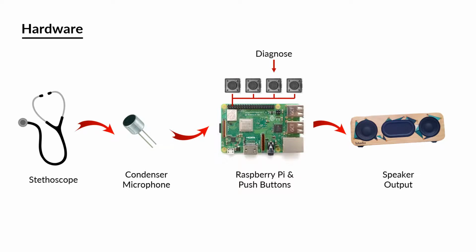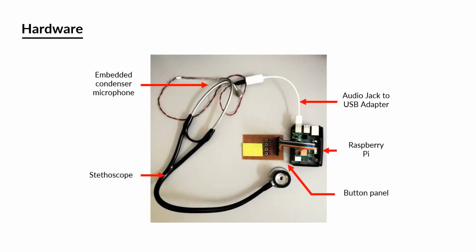The user can then press the Diagnose button, in which the device will diagnose the recorded PCG as being healthy or abnormal. Two playback buttons are available for the user to replay the results of the recording and the diagnosis. This figure shows the prototype that was created for the project.